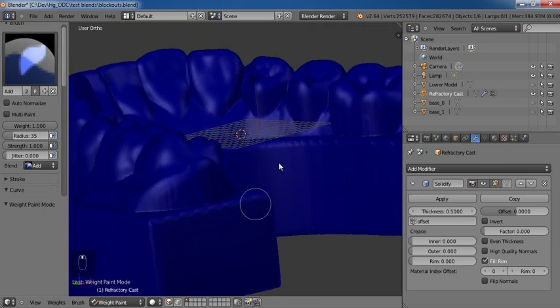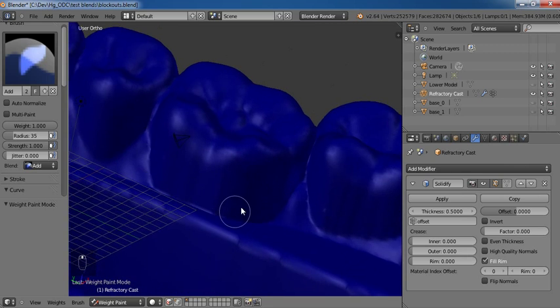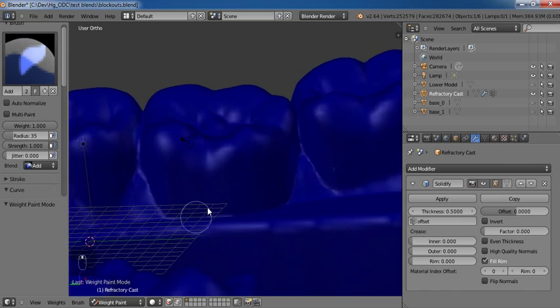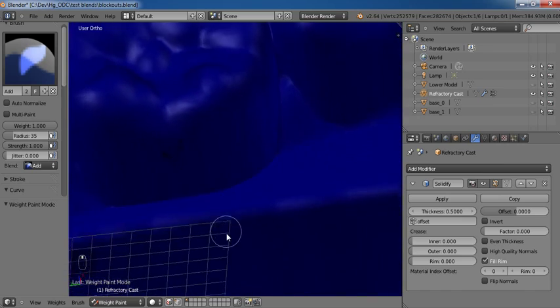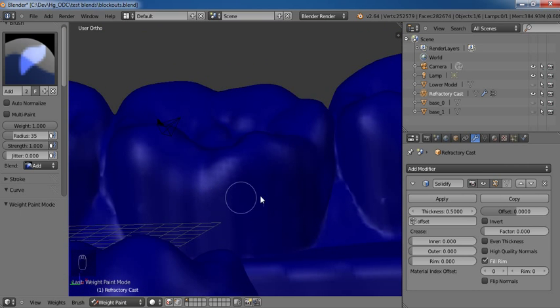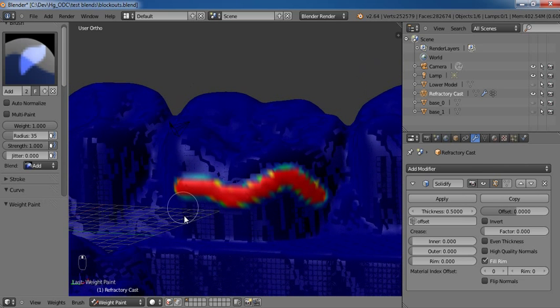Now let's say we were going to put a bracing arm on this tooth, and that bracing arm would follow the height of contour, which we haven't really marked. So you just kind of have to remember where it was, so that's not really good. What do you think the height of contour is? This doesn't look as awesome as you might have been hoping.